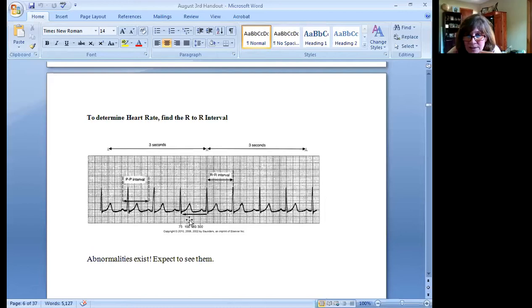Let's look at this. P wave, QRS, T. P wave, QRS, T. So you see this R to R interval, this R to this R. You see the beginning of the QRS to the end of the T. Do you see how the QT interval is actually half the length of the R to R interval? That's a good thing. When that QT is getting long, my friends, we are assessing and we are picking up that phone and we're gonna save the day.